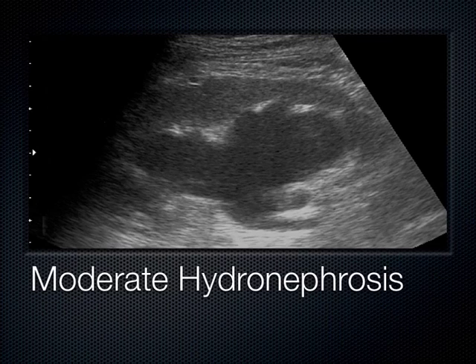This is what happens when we get a lot of hydronephrosis backing up in the kidney. Our cortex is starting to go away, and all those finger-like projections are now coalescing to one large hypo or anechoic area here seen in the pelvis of the kidney, and that's more like moderate hydronephrosis. When all those fingers kind of come together, we can still make out the cortex though. See out here we can still see cortex? If all I saw was a big black center where the kidney should be and there's no cortex left, it's very, very rare, but that would be severe hydronephrosis. The fact that I can still make out cortex to me tells me this is probably moderate.